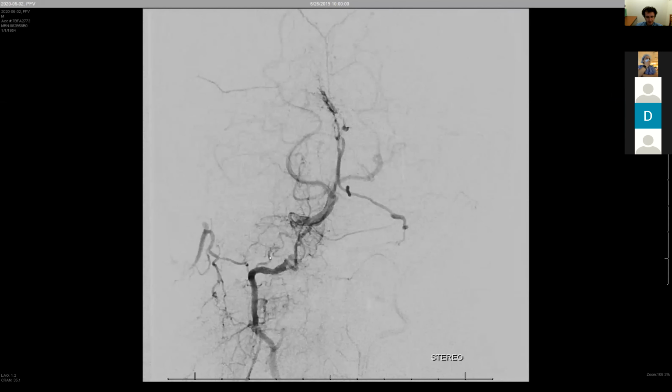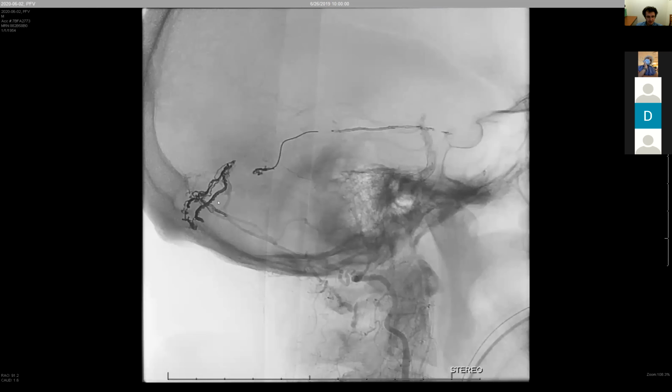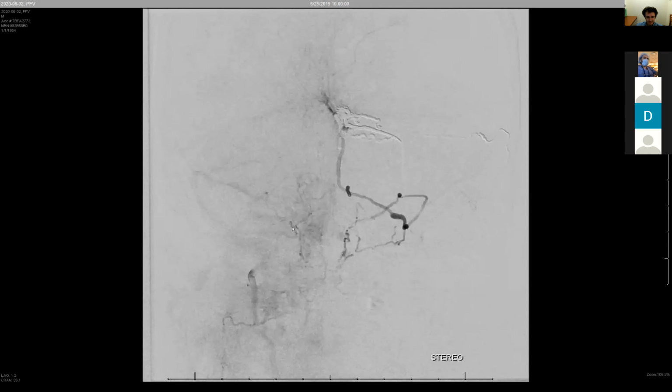And here in the lateral view, obviously it's a little bit of a hypoplastic vert. Here's the supply to the posterior meningeal system, the artery of the tentorium cerebelli, coming up to the fistula here, and that's the venous drainage of the fistula coming through this cerebellar vein, ultimately decompressing into the veins of the brainstem. And that's the source of the problem.